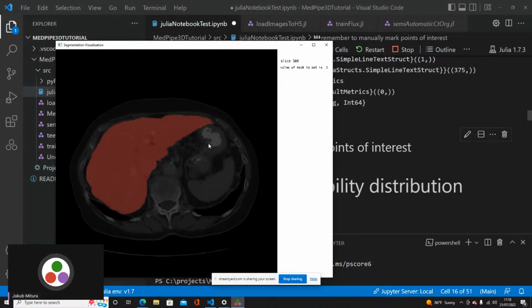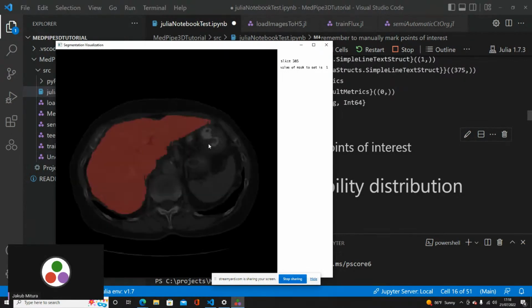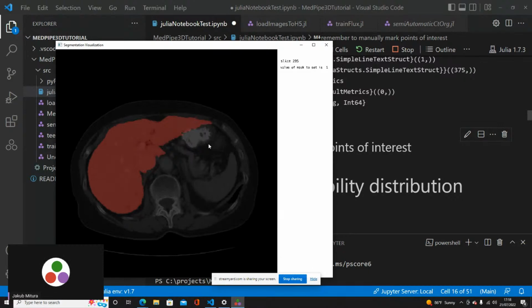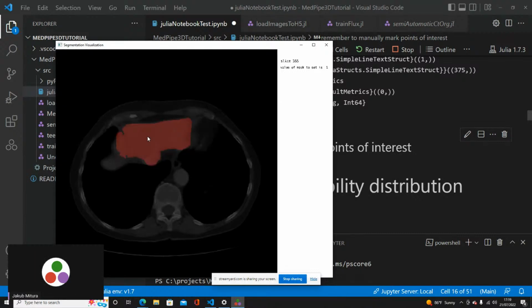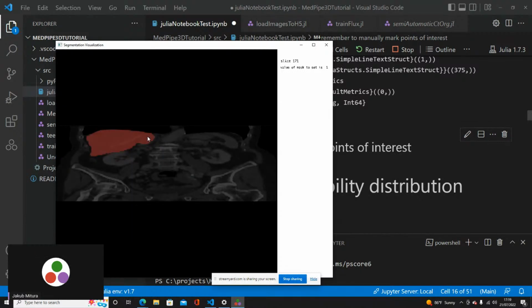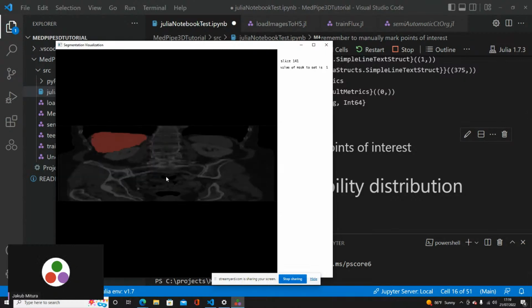Now, what does it change? First of all, when you look at this, it looks exactly the same. But it looks the same because we did not change the X and Y direction. X and Y is the same. But here you see that the image looks compressed. It looks like the person would be pressed from top and bottom.